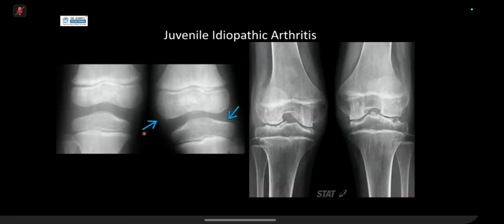So, a patient, both legs, one more affected with arthritis on the left and not on the right. You can see the epiphysis is a lot bigger on the distal femur, and the epiphysis as well. And then this is one that has bilateral JIA involvement of both knees, and you can see that widening of the intercondylar notch.